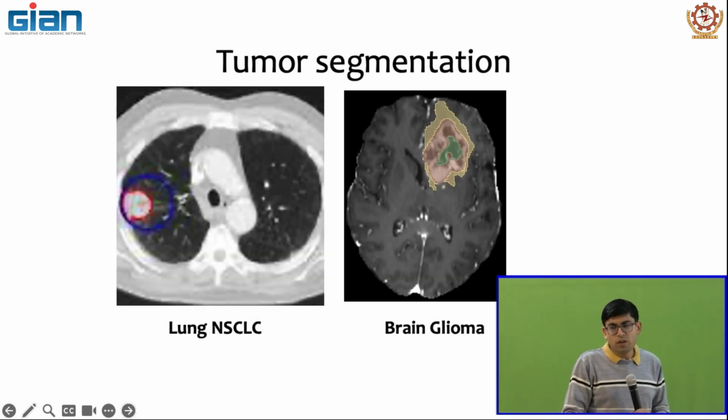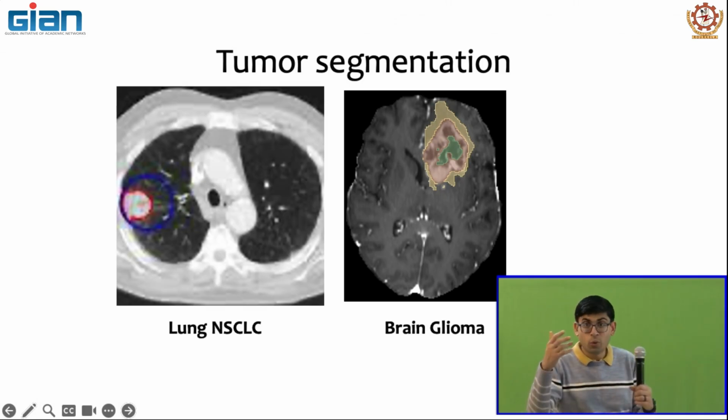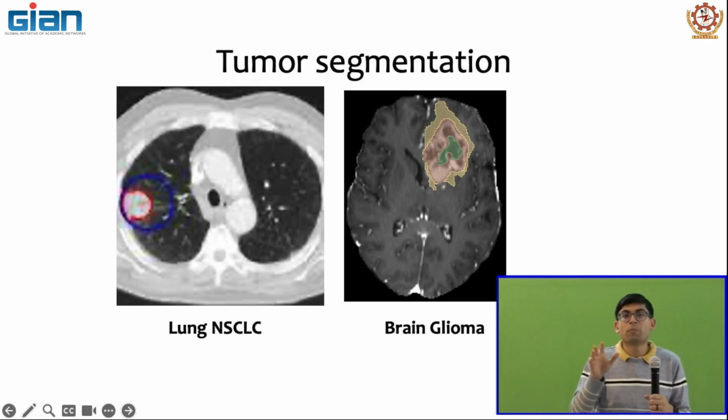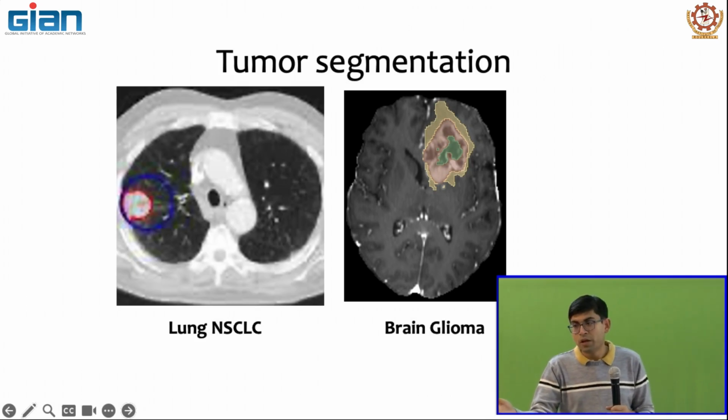Like I said, we'll look at the tumor segmentations, other objects of interest. We'll also look at pathology images. If you remember earlier today, we covered digital pathology and how you can open these digital pathology scans. These are huge images, so bear with us. It'll take some time to actually load these images because we don't really have the specialized software for that. We'll still use Python for doing this. And with that, I'll hand it over to Moinak.